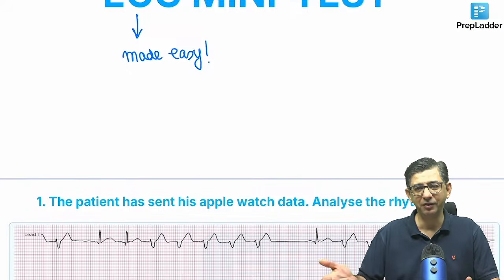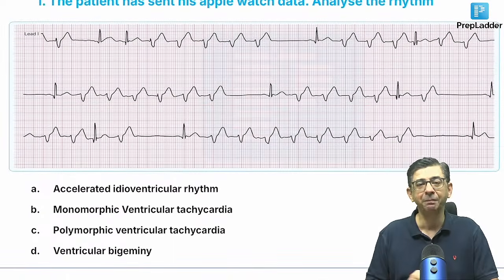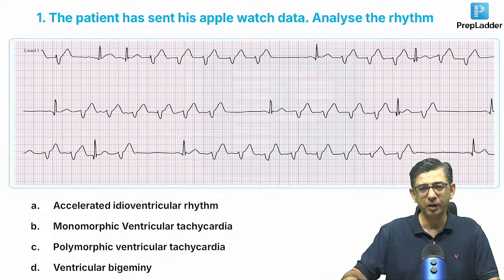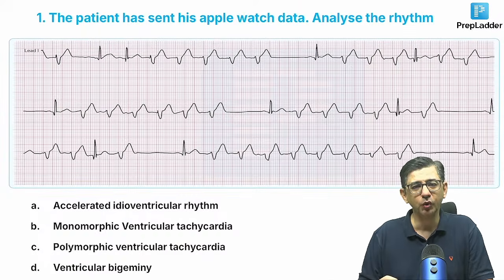So let me say we have a patient who has sent me Apple Watch data for today, and my job would be to analyze the rhythm. And I have given a couple of options as well so that I can make it relatively easier for you. So we can get started.